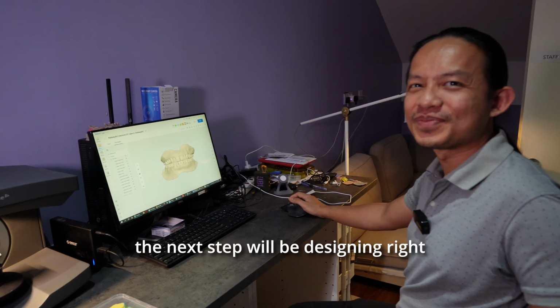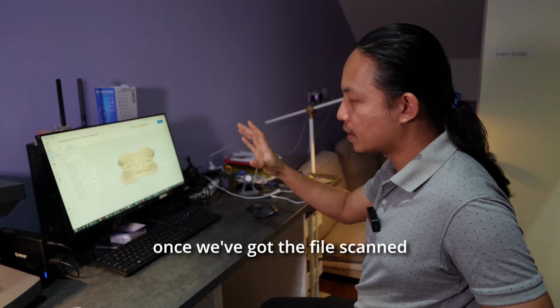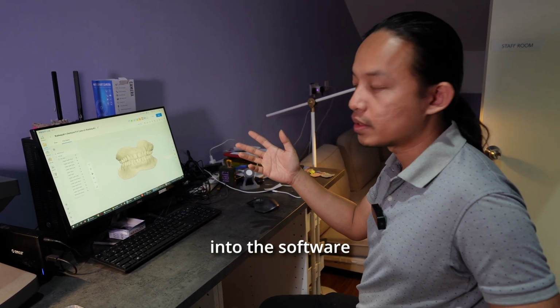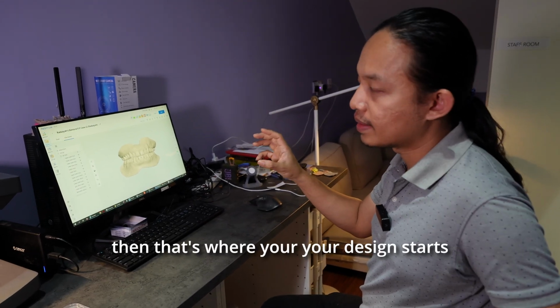The next step will be designing, right? Next step will be design. So once we have the file scanned, we upload the STL file into the software. Once you are in the software, that's where your design starts.